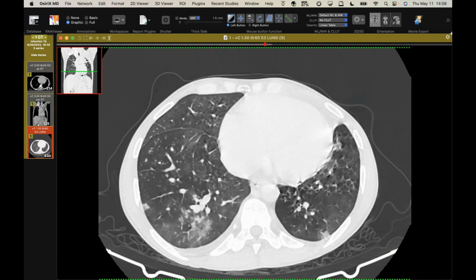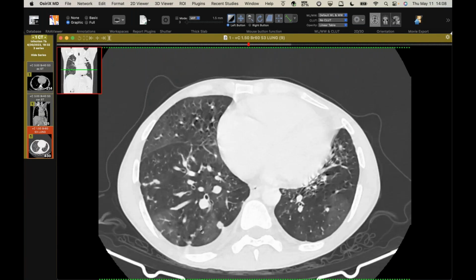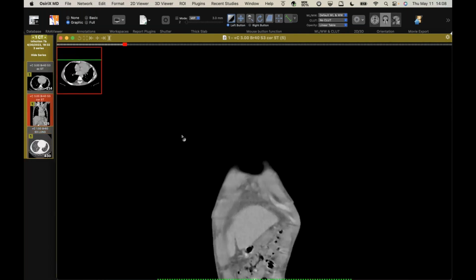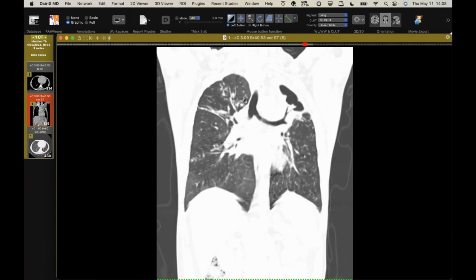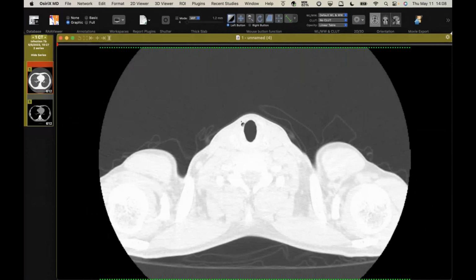This is probably some hemorrhage or something related to all the infection. But ultimately, it really becomes, of course, a sputum diagnosis. But you can see really bad TB in the lungs here, pretty typical of that chronic cavity. You could spill stuff out of the cavity into the airways, but this cavity is pretty dry looking. There's not a lot of fluid in there, so all these little tree and bud clusters correlate with active TB.